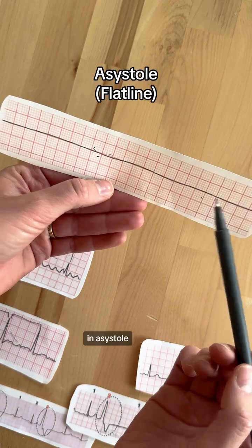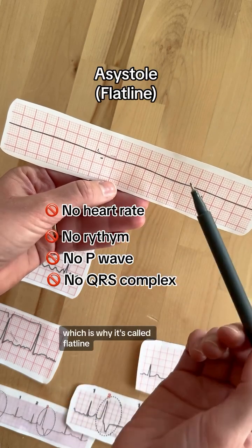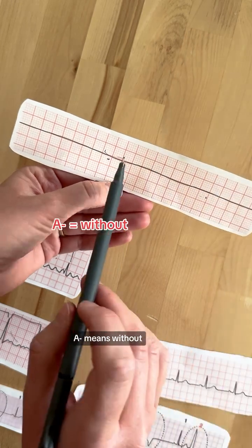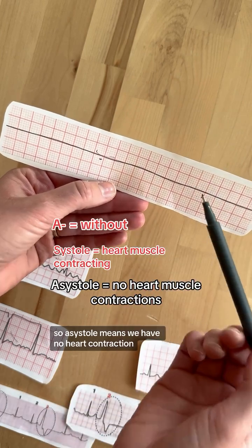In asystole, we have no heart rate, no rhythm, no P waves, and no QRS complex, which is why it's called flatline. If you remember your medical terminology, A means without, and systole means the heart muscle is contracting. So asystole means we have no heart contraction.